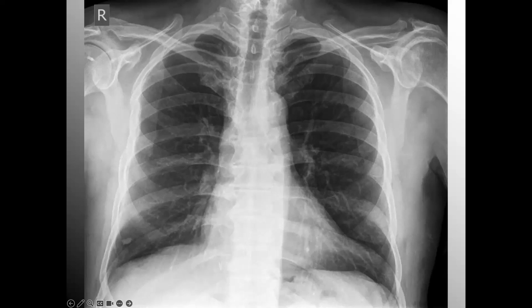Anytime you have aortic ectasia, it could imply that they're developing maybe an aneurysm, or they have chronic hypertension, under-controlled or not well-controlled, or maybe they're developing a hypertensive crisis. I would look for things like an uncoiling of the aorta, prominent aortic knob. Don't really have that here, but I would argue there's some calcium here. Calcification ring is beginning. A good way to tell if their aorta is widened is the border of the right and left wider than the spine itself.